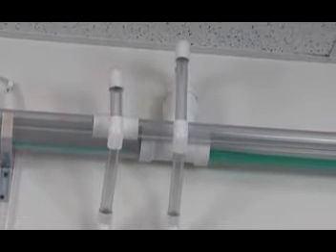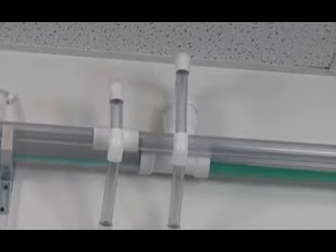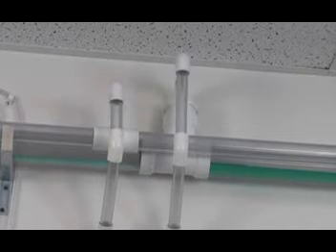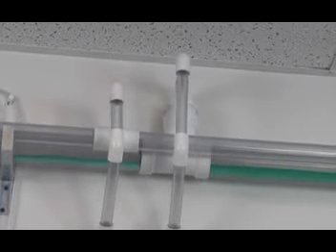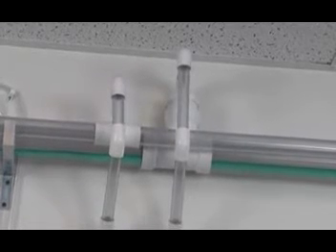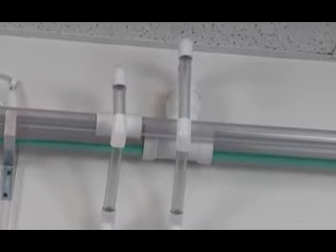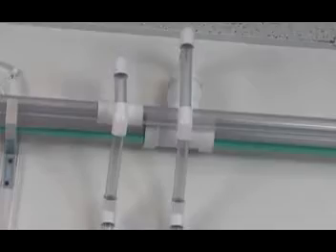All the liquid that's going into the trunk line towards the collection tank will flow because it has air being introduced into the system to help with the flow of the liquids and the solids. When you shut this off, gravity takes over, and then the liquids will flow, and if the slope of the pipe isn't correct, the solids may build up in the pipe and not flow towards the collection tank.